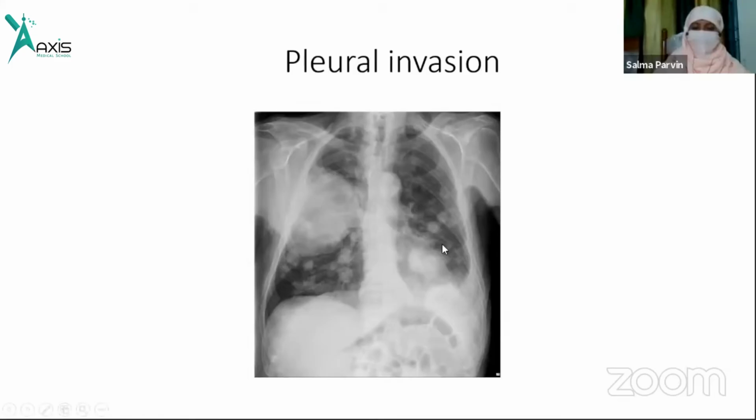In this film we can see that there is a large mass and smaller masses are also seen in both the films.